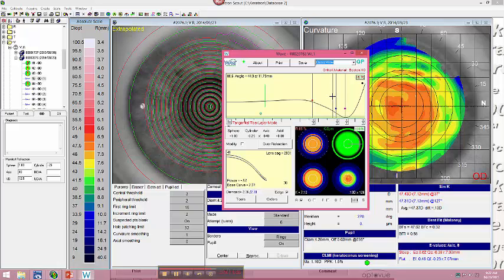The limbal clearance at 170 is 90.6, maybe a little high. I'd like it to be 70 to 90, so let's adjust that blue down, maybe 1, and then get the center back at 200 approximately. So now it's at 84.2, and I'm going to fine tune the edge a little bit. To fine tune the edge a little bit, see how it got thicker there?